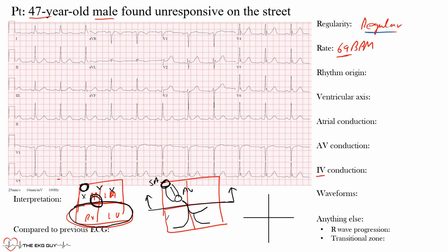Now when we're talking about sinus rhythm, we're pretty much focusing up here. We don't really care so much what's going on down there, and that's why we're focusing on the P waves. Remember, atrial depolarization is here, our atria, so we're focusing up there. If normal conduction is heading in this direction, and we have lead 1 here, lead AVL here, we have our inferior leads 2, 3, and AVF, then we should see upright P waves in those leads.